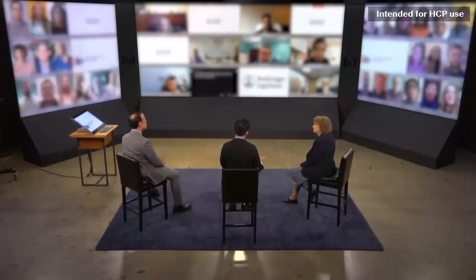Right, and I think the other thing is that as good as our techniques are, ground glass can just represent simple alveolitis in the case of interstitial lung disease, or it may be representative of a very early fibrosis, or what we call sub-resolution fibrosis. And again, we're not only looking for the density of ground glass, but what is that distribution? And was it there before? And if it's changing? Because if you see ground glass nodules and they're clustered, you're thinking more infection or aspiration than interstitial lung disease. That's a great point, Rob.